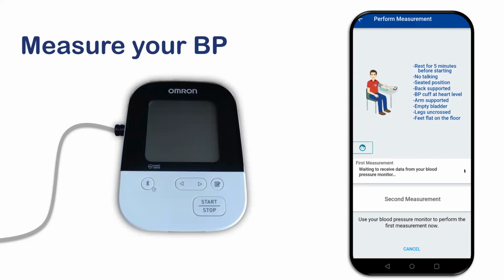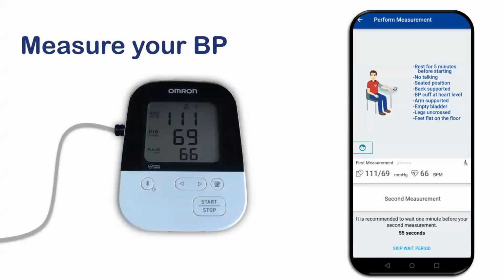When you are ready, find the button that says Start Stop on your blood pressure machine, and press Start. Your machine will send your blood pressure reading straight to your phone.